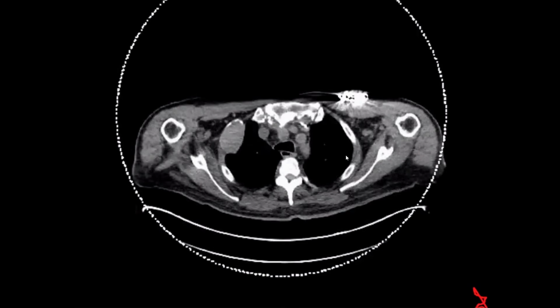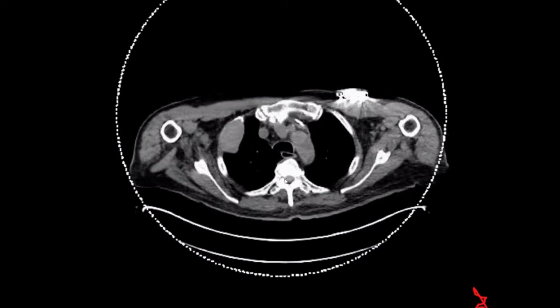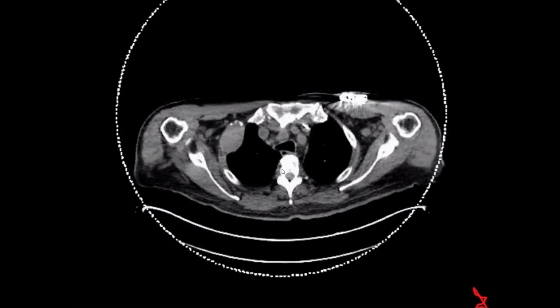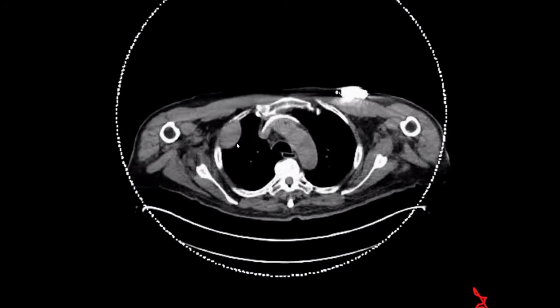It's one of our differential diagnoses, but in fibrous dysplasia the cortex should be well defined and surrounding the mass, but here it's punched out. The cortex is deficient, and also the patient is elderly, above 60. About multiple myeloma, we would also think of it in older patients. You are very close, but it's not multiple myeloma.